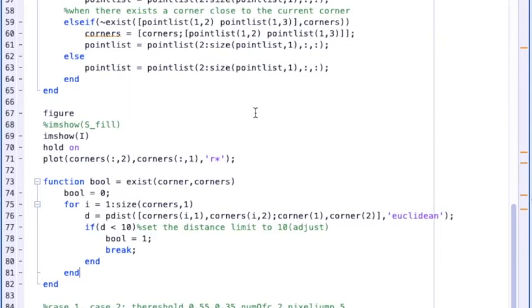So far, all the samples that we used are arms, legs, and fingers and toes. They are all clear structures among the entire skeleton, but this method doesn't work well on some complex structures like the chest.